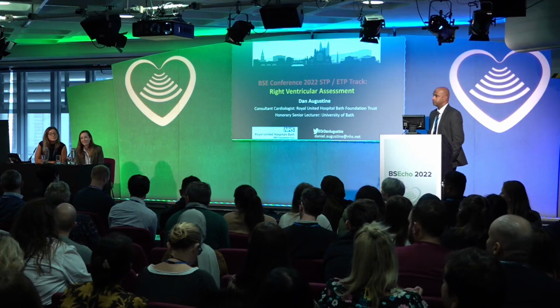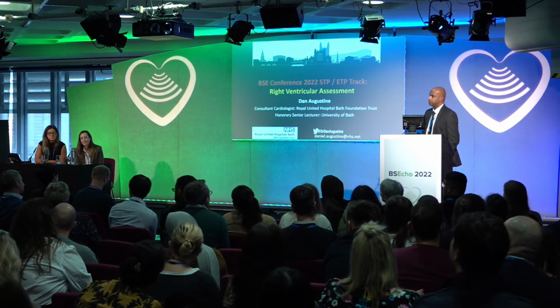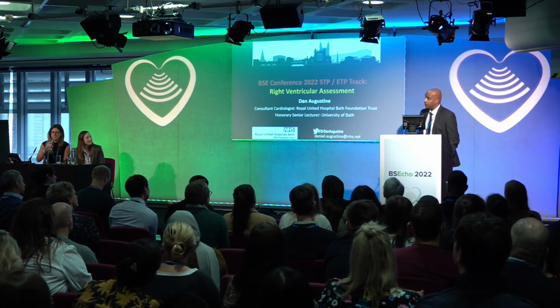Just one thing. I don't think you mentioned the RVOT acceleration time. Do you use that? We use it in terms of pulmonary hypertension. Is that what you meant? Yes. That didn't differentiate between those who had PH and those who didn't in the low probability group. But you do use it? If you've got a very poor TR, or no TR, it's quite a good one. Yes, you could.